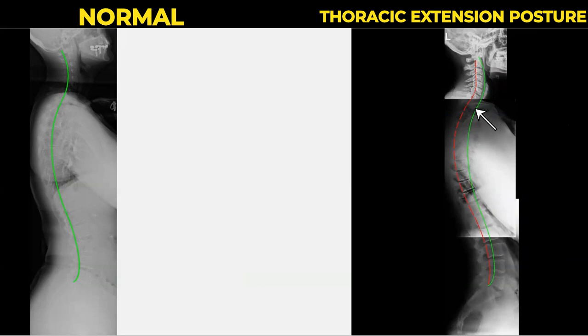In this case, you'll see that the upper thoracic spine is now behind the lower thoracic spine, okay? So you'll see how this is behind, okay? And when it's behind, that means that there's an extension of the thorax or thoracic spine. Another consequence of this is, because here's the reference point, okay, and the head reference point is at the ear, you'll see that the head is also driving forward as this is driving back and into extension.